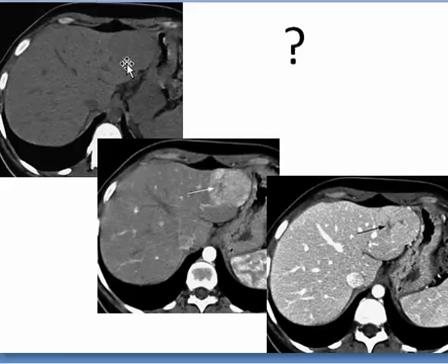Hypodensity in CT, homogeneous enhancement in arterial, and enhancement similar to the liver, reaching that of the liver, with central scar. So the key point here is the presence of a central scar.